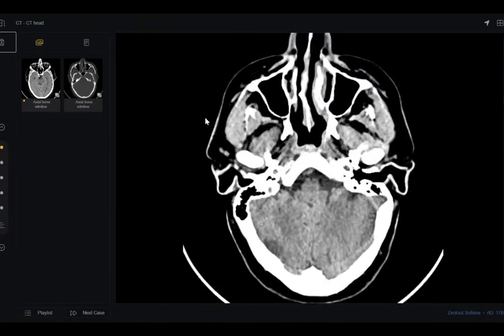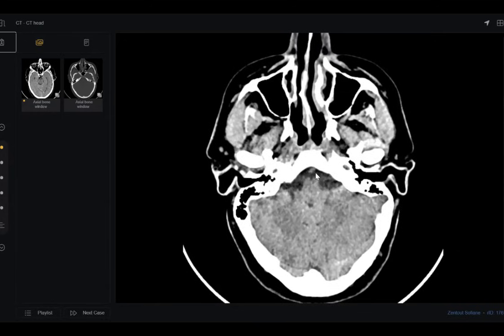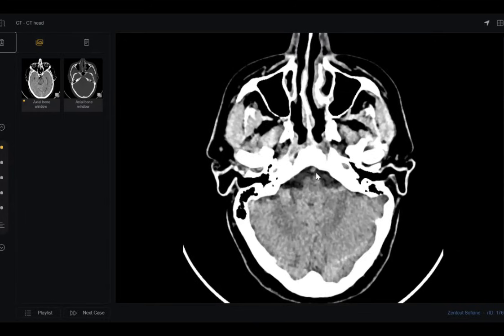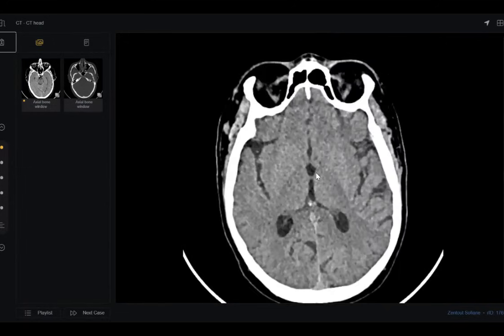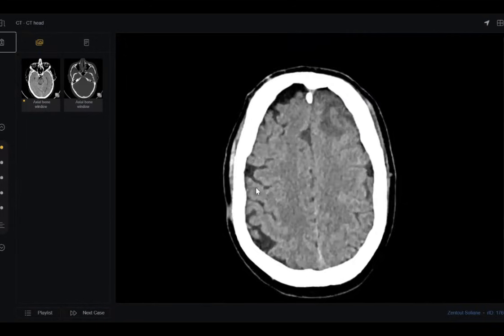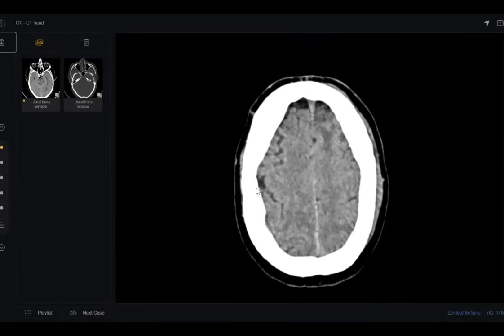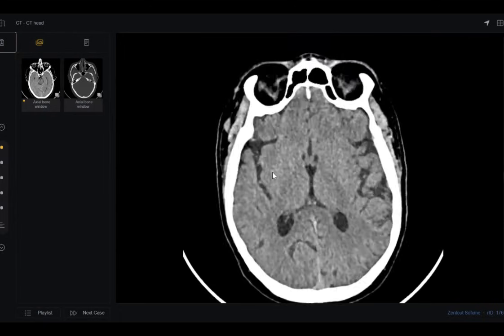Why? Because if you look here at the basilar, you will see the hyperdensity at the periphery, and the center, if you follow it, is not. I think this is non-contrast, in my opinion. Besides that, we are trying to look at the periphery. In contrast, we may pick up some veins, some cortical veins that take contrast enhancement. Here, I can't pick up any enhancement.